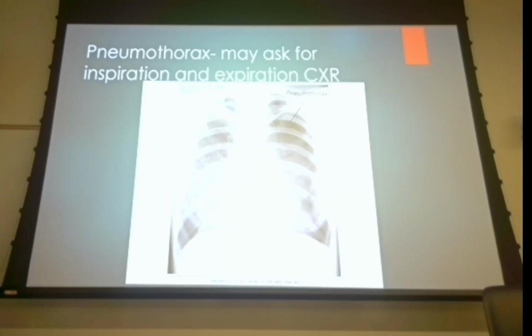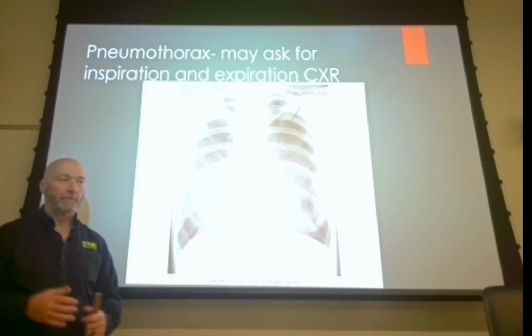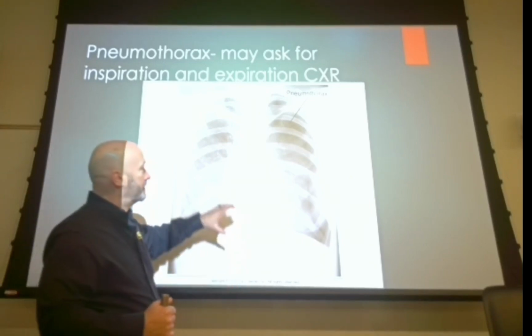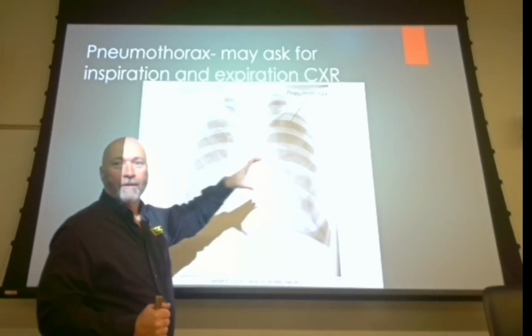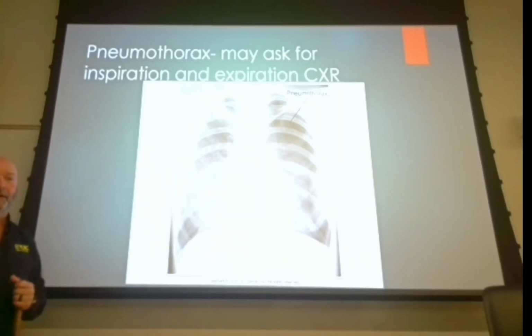Came in, obviously short of breath. We didn't know what happened to him, but we asked him, what happened? He said, I coughed, and then I couldn't catch my breath. So we took an X-ray, and the entire lung was about that big right there. Beautiful set of ribs. Prettiest set of ribs I ever saw, because it had no lung markings whatsoever.